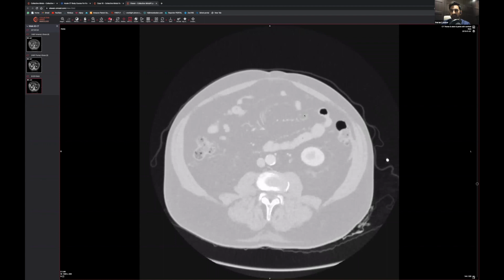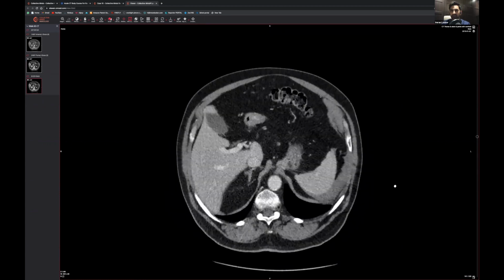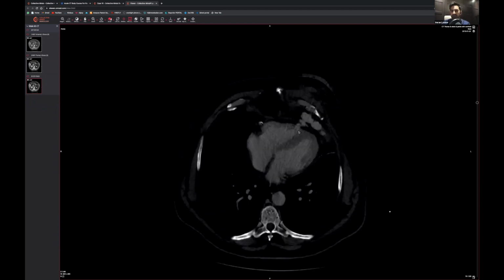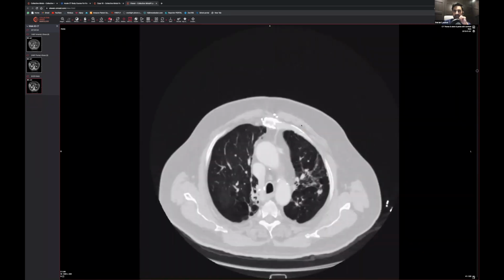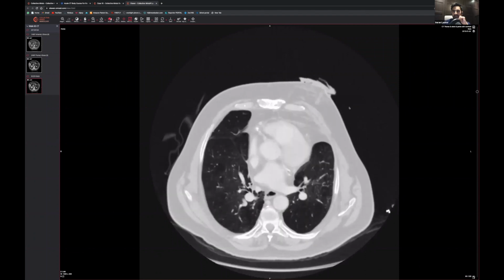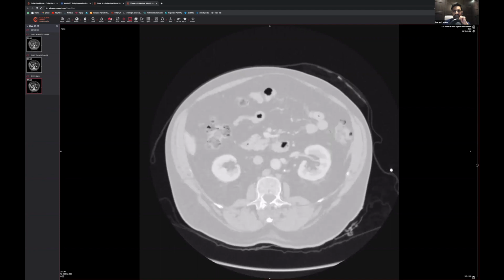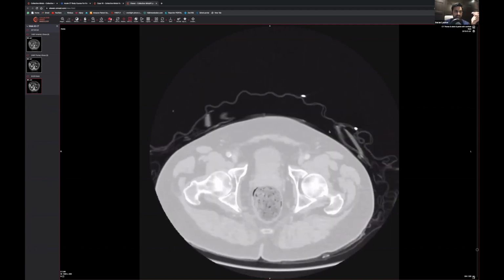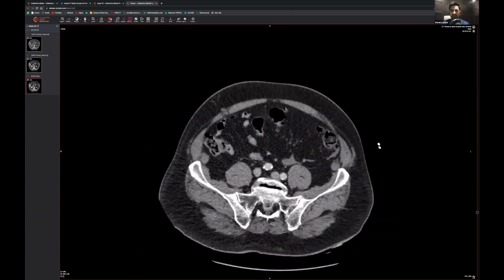This patient's got what looks like a stab wound located within the anterior chest over here, extending through into that ventricle. And the one last thing I'd like to say is actually what you do is also check the lung windows, because sometimes you see plasters in different places, so we can see a plaster there, is there any plasters anywhere else? And that doesn't look like it. So sometimes that could be a clue to try and find out where another stab wound could be. But anyway, that's a trauma case for you guys, and quite a horrendous trauma, isn't it?